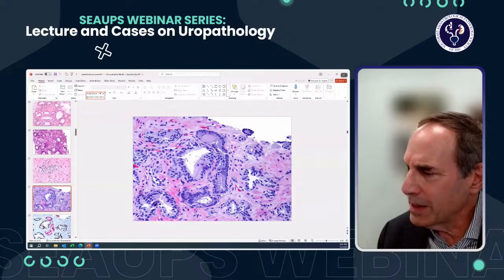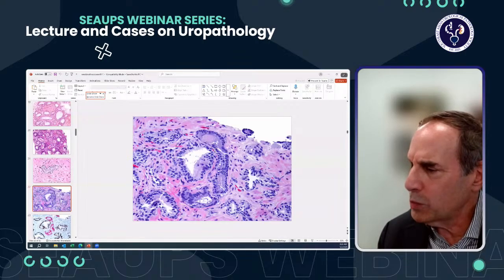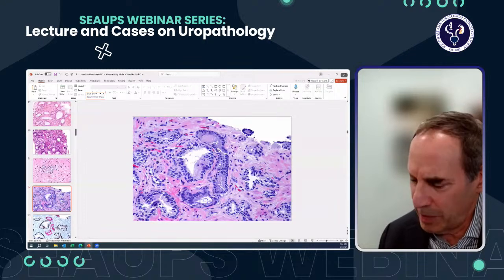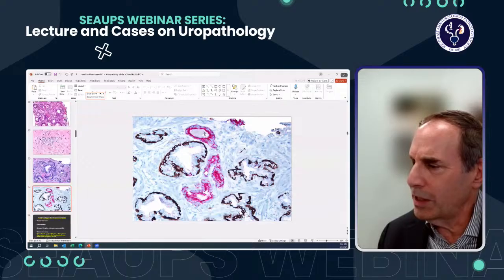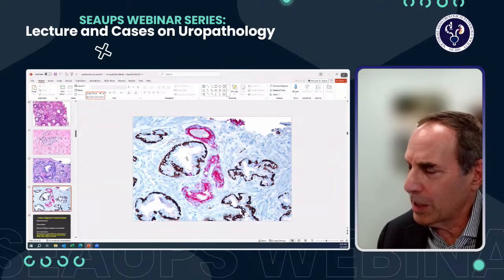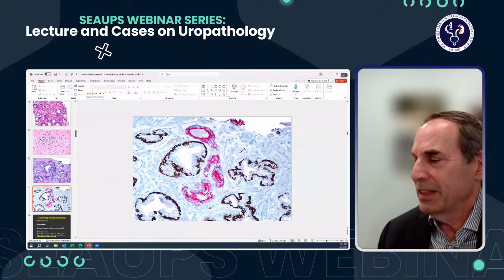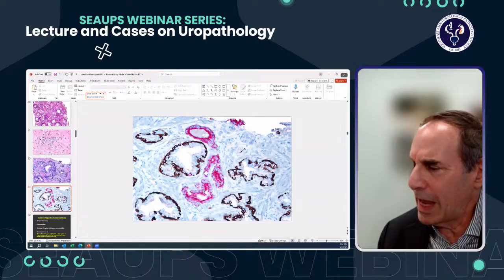glands. So the fact that this atypical gland is tightly packed in between two benign glands, it's in an abnormal place where one would not expect to see benign glands. Consequently, this cannot be high-grade PIN. So this has to be cancer. And then if you do the stain for PIN, high molecular weight cytokeratin and racemase, you can see it helps to diagnose cancer given the absence of basal cells and the strong racemase.